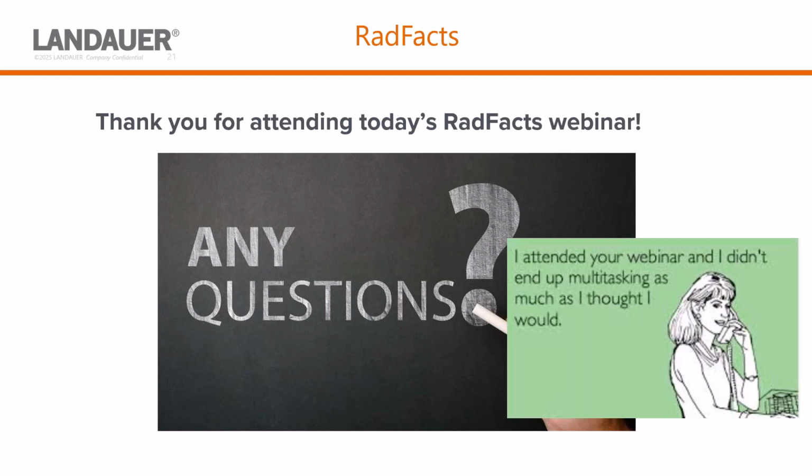I know that probably was a lot, and it didn't really make that much sense. But if you have any questions, your ALARA levels will be on one of those reports, the ALARA recap, or customer service can tell you exactly what you set them as, because we have a default, but you could also go in and adjust it.